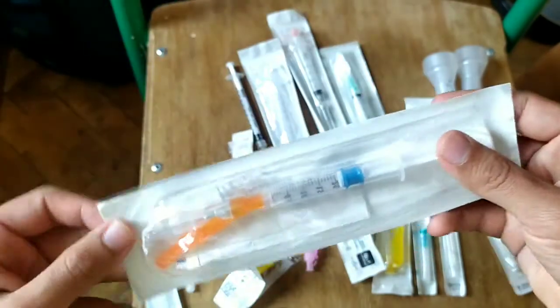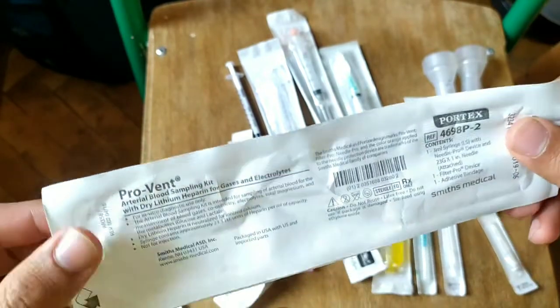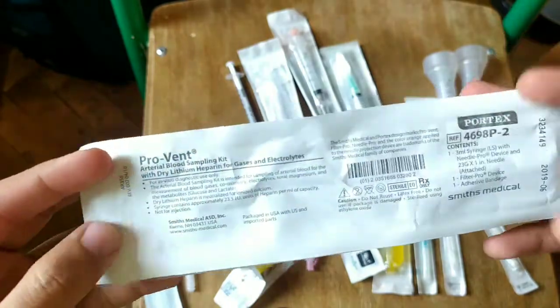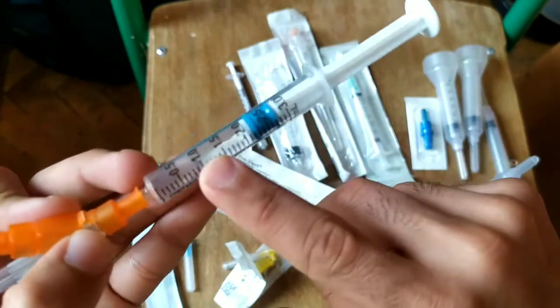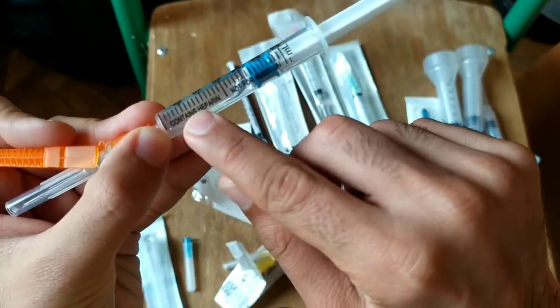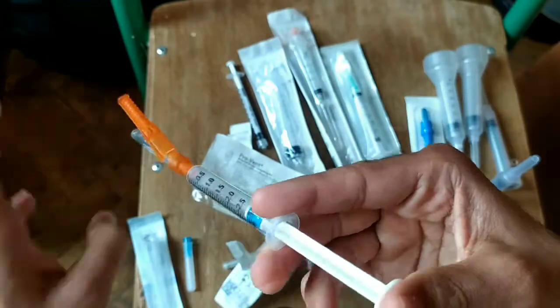Now lastly, there are specially manufactured, prepared sets of needles and syringes. As you can see here, it is an arterial blood sampling kit. It does not carry a normal syringe. It has a syringe which is coated from inside with lithium heparin, so that the blood does not coagulate once the arterial blood is in it. Here it is written that it contains heparin, and it is not for injection, which means we have to collect the sample with it.